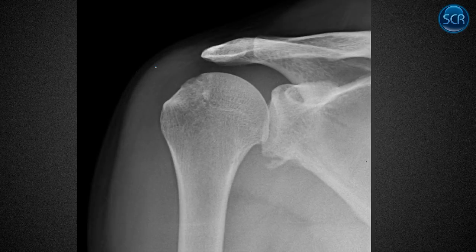And I mentioned a glenoid rim fracture, which is called a Bankart lesion, an osseous Bankart. You can have a labral tear, which is a soft tissue Bankart. So there's a little fracture here, a little bit of irregularity here. I don't know that this is the best Hill-Sachs example, but there is a little Hill-Sachs lesion there. But the Bankart lesion is the more obvious thing in this case. And so these two things contacted one another, and this is the result of a dislocation.